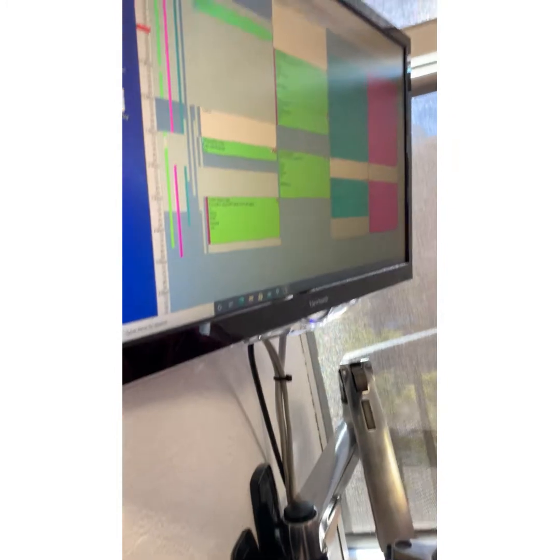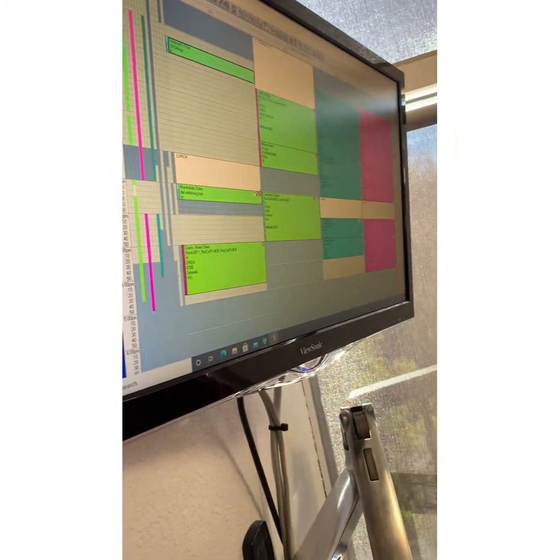Yes. So I can just go to my chart. I don't have to go into the panel. We used to have to go into the Dentrix. So we should go now into the schedule. Okay, so I'm going to pull up the chart. Look for the symbol.